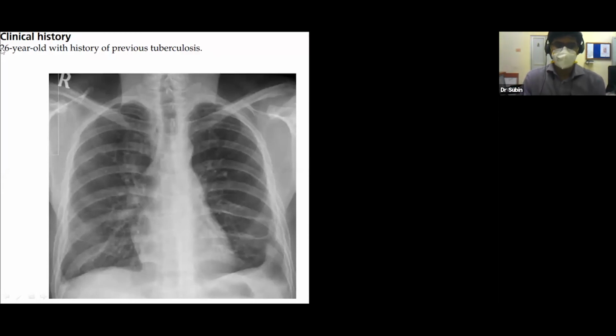It's a young patient also. So I'll just go through this quickly. So that's the trachea. This is how I'm going to view the X-ray. Trachea, the bronchus I'm seeing, then again the heart borders. I can see that this side is looking a bit bulged, more prominent on the right side, but there is this deviation. If you can see, there's rotation to this side, which is probably the reason for this side to be more apparent. There is definitely this blunting of the CP angle which is seen.